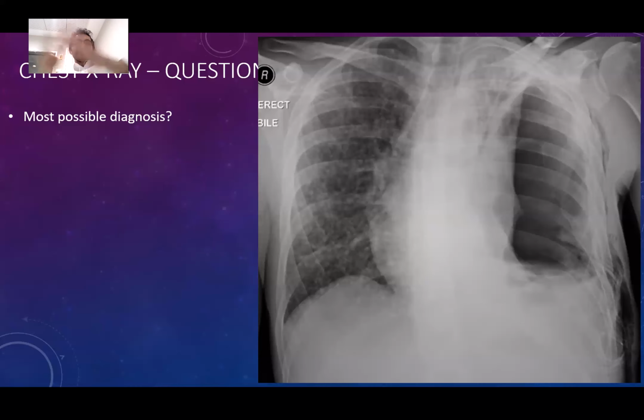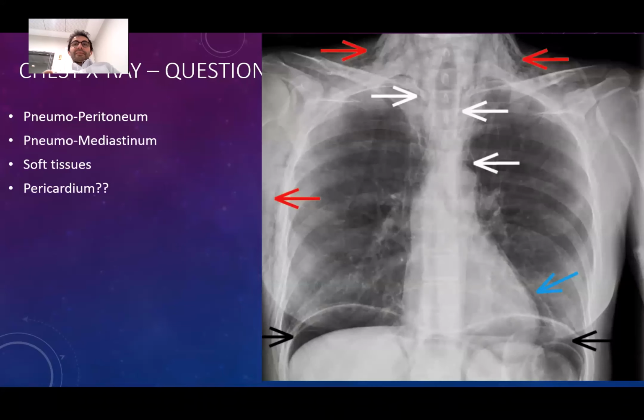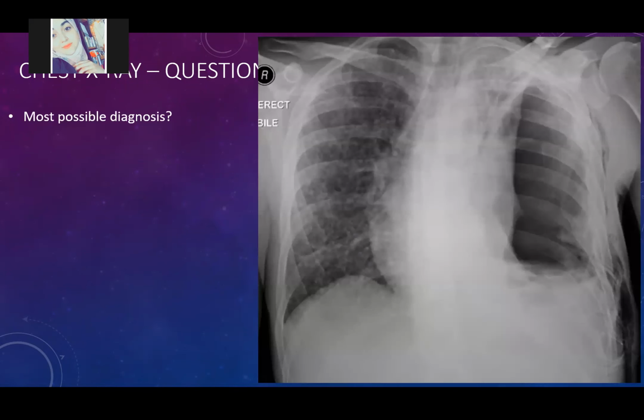You asked the same question 2 lectures ago as well. Anyway. So you see the pneumothorax, right? So you have to name the pneumothorax. We are seeing fluid leveling, which is pleural effusion. We have to name this. We are seeing interstitial nodular findings. We have to name this.